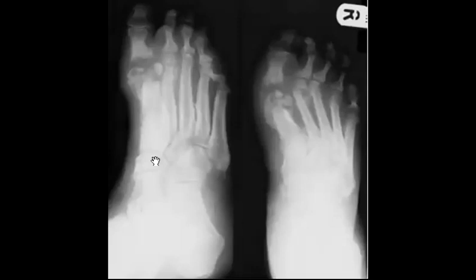So what is your impression after that? Again, destruction. So the big titles, after you finish your description, you'll find that there is destruction, which is multiple D's.